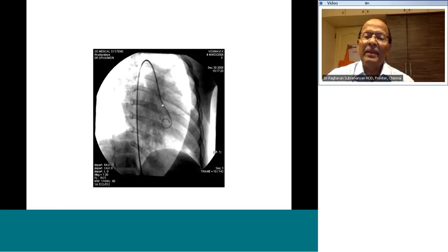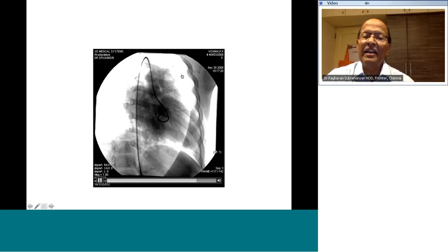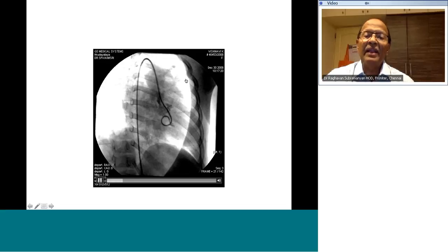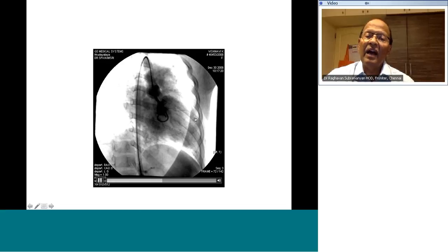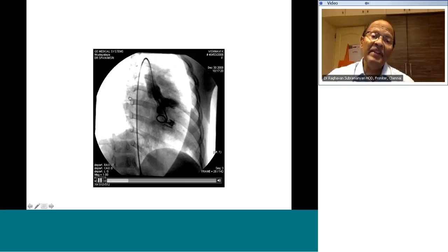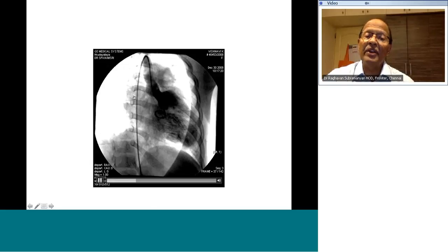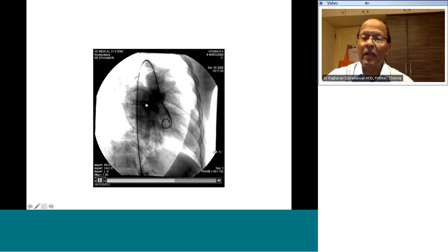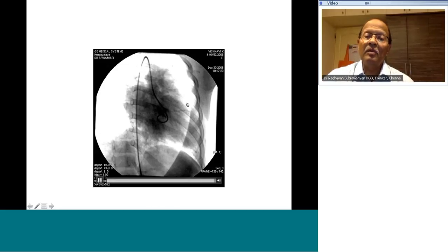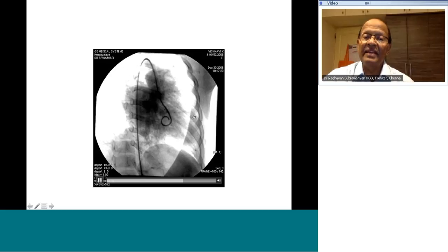There happens to be a large pulmonary blood flow because of very rapid circulation in a dilated pulmonary artery, and most likely this patient is likely to have hyperkinetic pulmonary arterial hypertension. The pulmonary venous connection appears to be normal, and there is a large intra-atrial communication. Okay. In addition, you can also talk about LV function, eyeballing of the LV size.